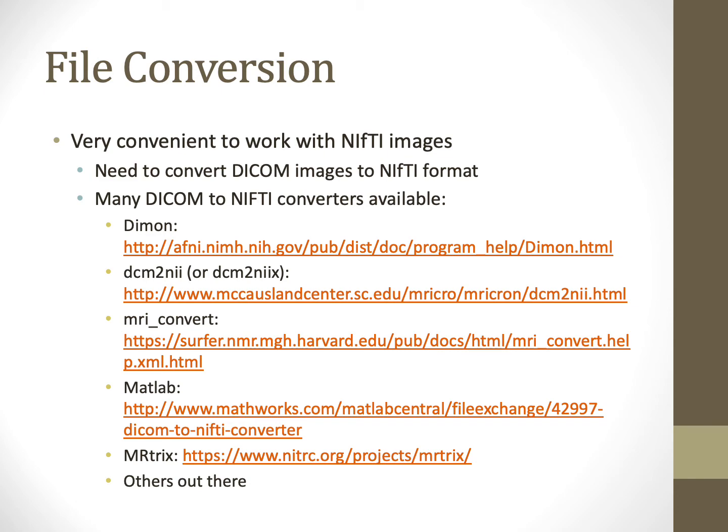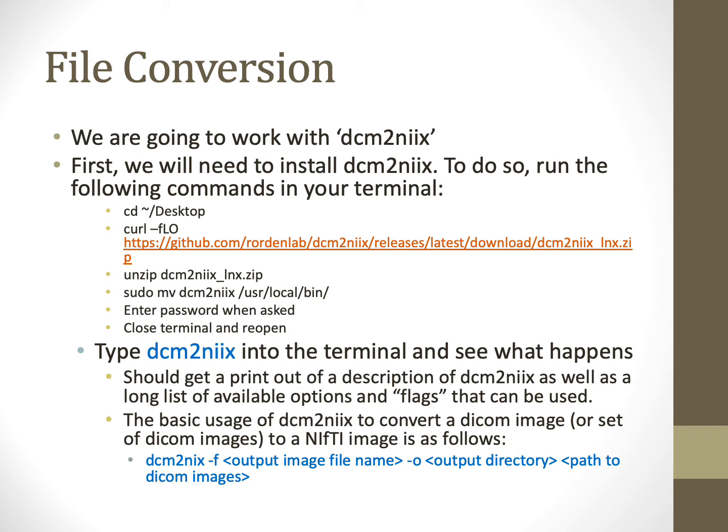There are many different DICOM to NIFTI converters available, as seen here. We're going to work with a commonly used one called dcm2niix. First, to use this, we will need to install dcm2niix on our virtual machines. To do so, follow the following commands in your terminal. After installing dcm2niix, type dcm2niix into the terminal and see what happens. You should see a printout of the description of dcm2niix, as well as a long list of available options and flags that can be used.